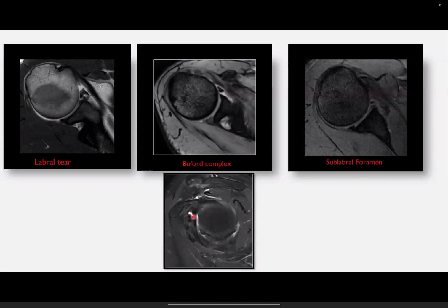So we should confirm on the sagittal. There is significant thickening of the middle glenohumeral ligament, because it's obliquely oriented. It arises anteriorly near the SGHL and goes like this underneath the subscapularis tendon. So confirm on sagittal, and you can see there is significant attenuation of the anterior labrum and a thickened MGHL. So you should not call it a tear.